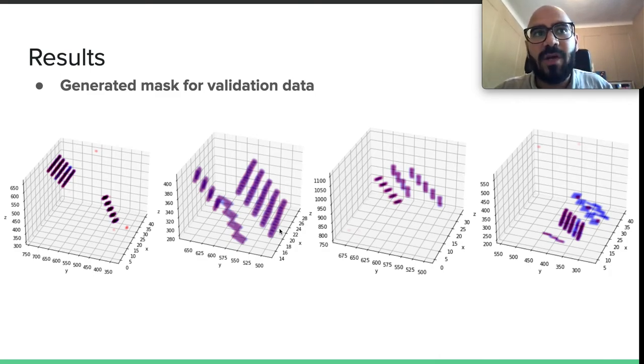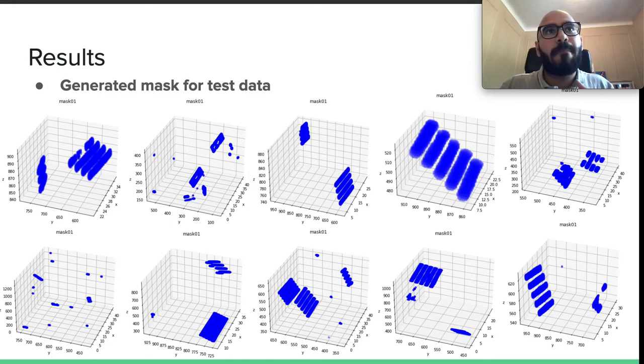Our prediction is not perfect, but it's kind of good. As you can see, we predicted a dot here that is not a seed. And here there are some ground truth seeds that the model has not covered. But in these two images, the coverage is pretty much 100% and very clean with no false negatives, maybe except this spot.